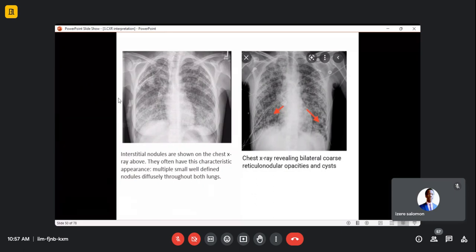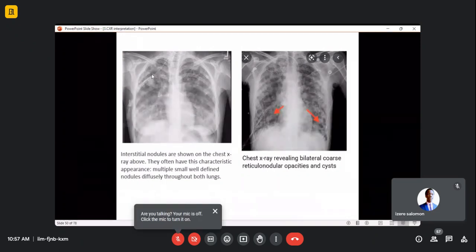Even if in 90% of these lungs, they are nodular opacity, micronodular. But there are some areas where you can see like reticular here. Can you see? They are like reticular at that level. Even this one looks like the reticular.